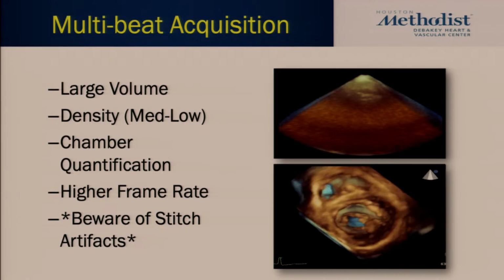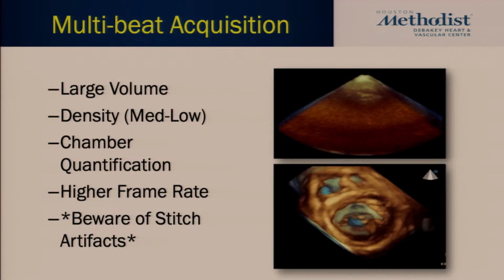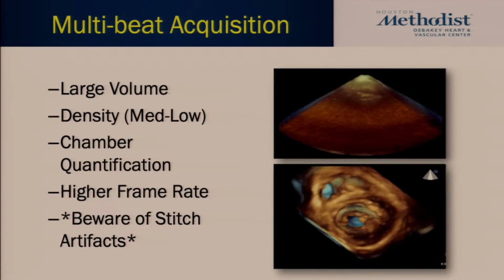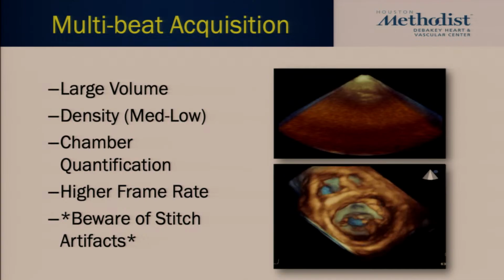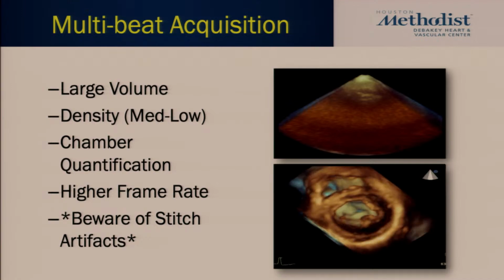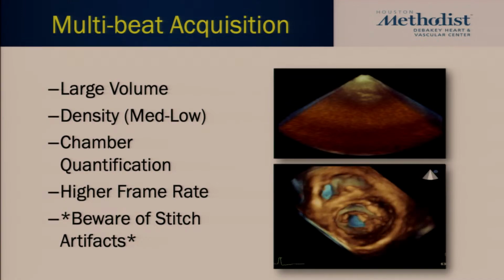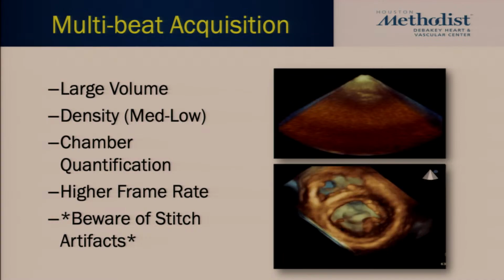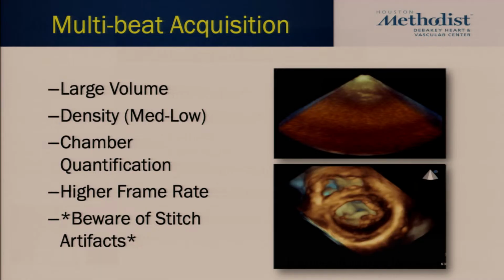And then multi-beat acquisition, really it's kind of a historic slide. We don't do multi-beat really anymore. Early days, single beat had such a low frame rate, you had no choice. 15 years ago when 3D echo became commercially available, the single beat volume rates were so low that it was very stroboscopic. You couldn't be sure you had end systole, so we would often stitch together multiple beats. These days, single beat is so much better. We almost never veer out of single beat. So this is really a historic slide these days.